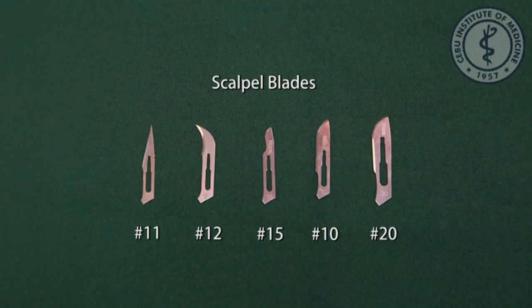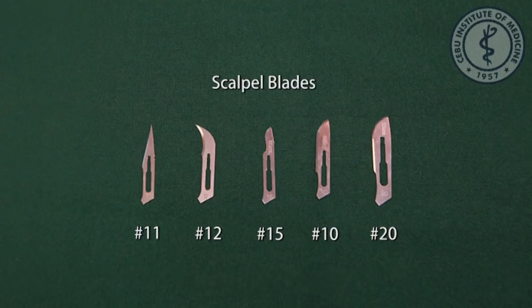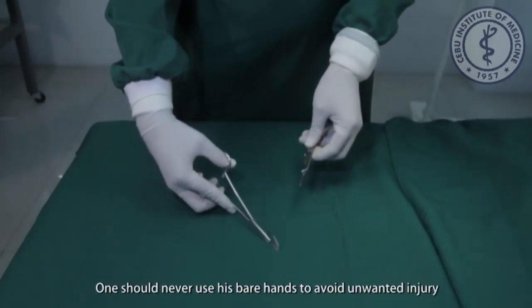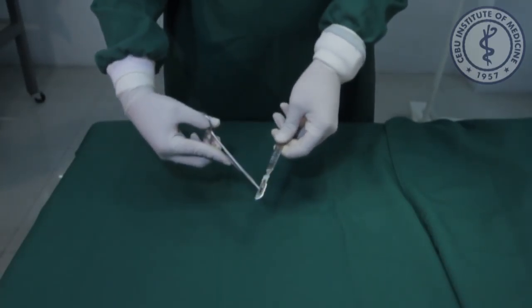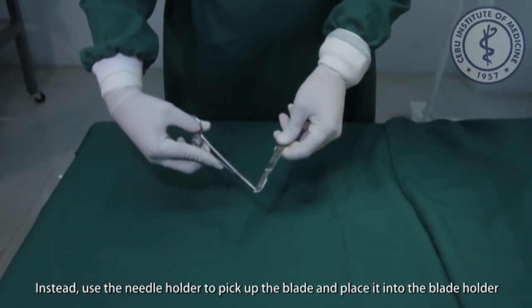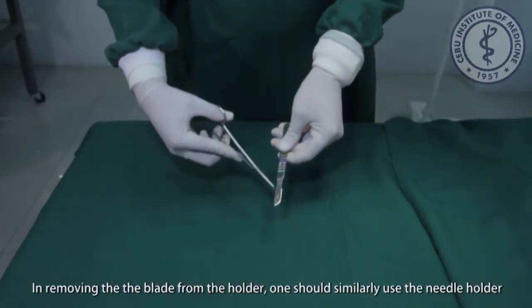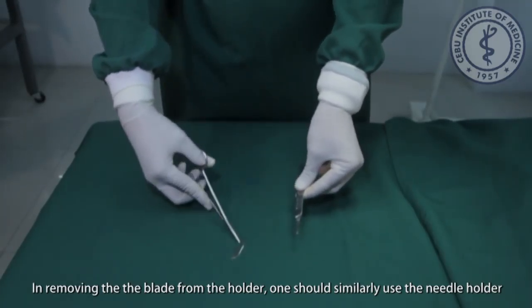Blade number 20, a large version of blade number 10 with a curved cutting edge and an unsharpened back edge, used for orthopedic and general surgical procedures. In placing the blade into the blade holder, one should never use bare hands to avoid unwanted injury. Instead, use the needle holder to pick up the blade and place it into the blade holder. In removing the blade from the holder, one should similarly use the needle holder.